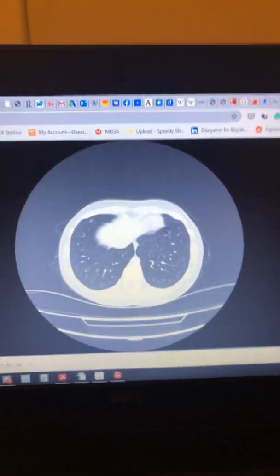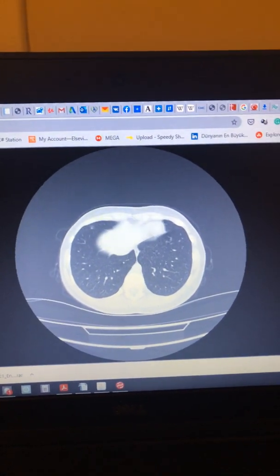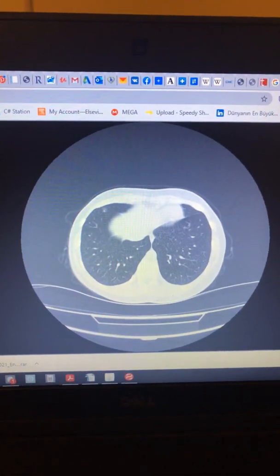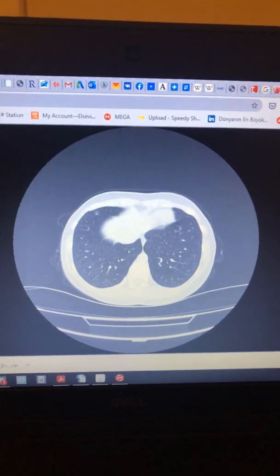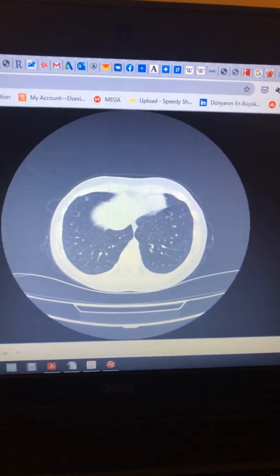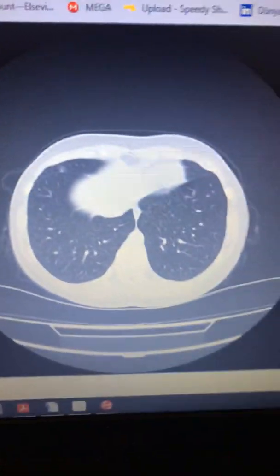And one of my patients from the clinic, now from the hospital this time, just sent me her ID card numbers to make me able to get into her thorax tomography records uploaded to the internet. I just entered her ID card numbers besides the password and I was able to enter her password-protected place. Let's go on. A 20-year-old female patient, as I told you.